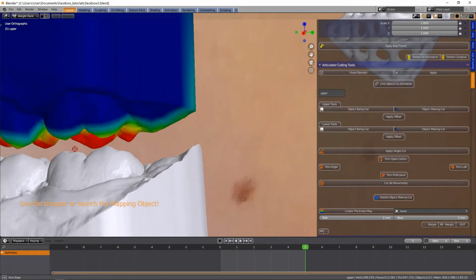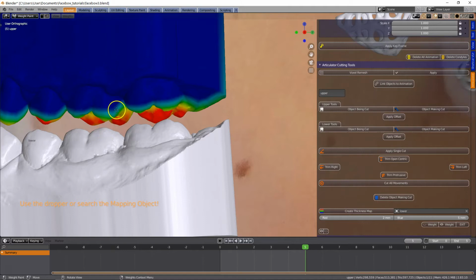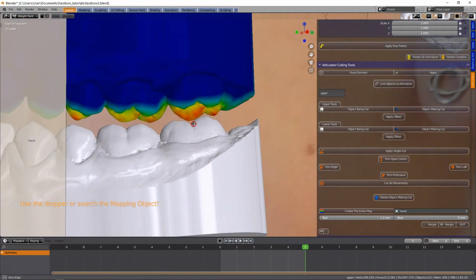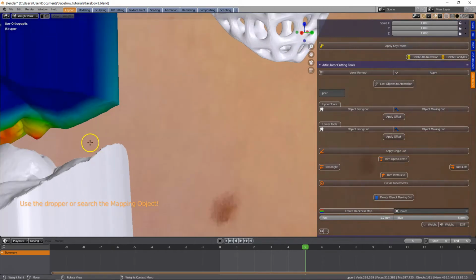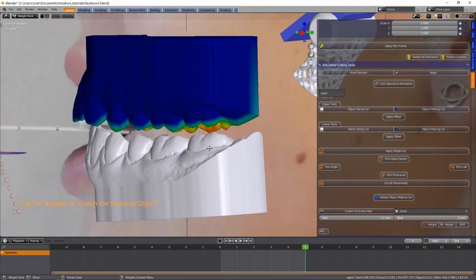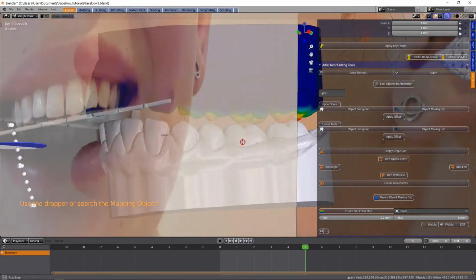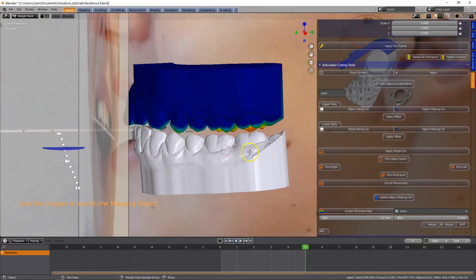see that this red zone is 2 millimeters away from the model. I can measure it more precisely by sliding this specific value. So if I want to see where the red starts, we will know that this is 1.2 millimeters away from the model. This is a good indication of how far to open up when making a splint or something when you're opening up the bite.